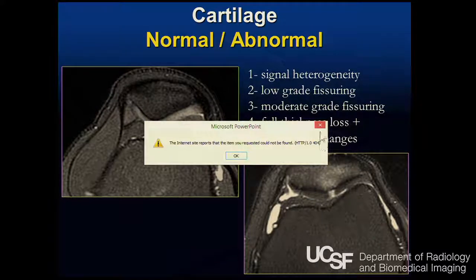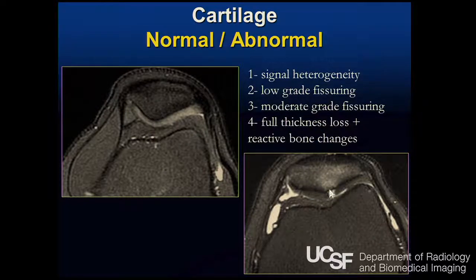This is helpful to our surgical colleagues because they will increasingly go in and do cartilage replacing procedures, be it a microfracture type surgery or an osteochondral implantation.